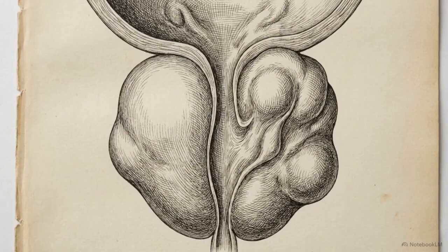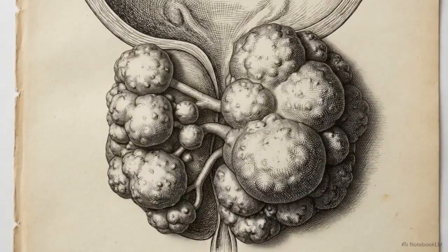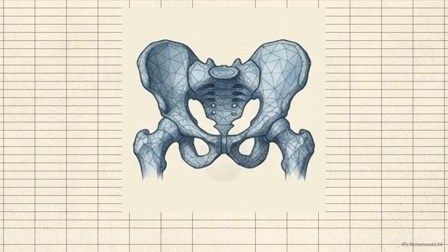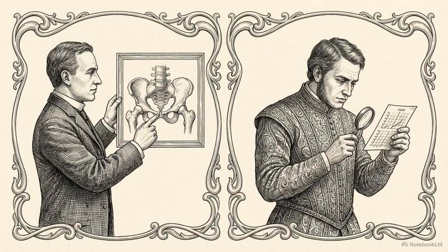The human prostate is a deceptive organ. Under the constant pressure of malignant growth or benign hyperplasia, the gland's internal architecture distorts, shifting against the rigid confines of the pelvic floor. In the modern clinic, the MRI functions as the master surgical map for navigating all pelvic interventions. But a map is only useful if everyone reads it the same way.